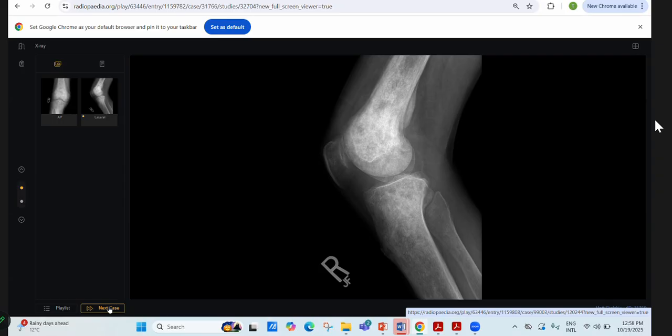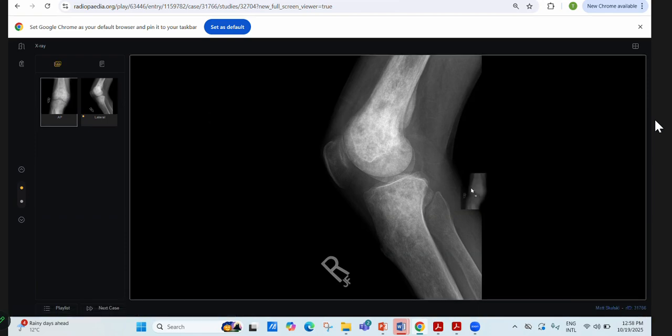Okay, I'm provided with frontal and lateral projections of a knee joint of an adult patient, in which I can see patchy areas of lucency and sclerosis diffusely involving the distal end of the visualized femur, and there is a subtle periosteal reaction along the anterior aspect of the femur as well. Similar findings are seen in the proximal tibia, and there is reduced bone density on the patella and visualized fibula. I would like to see other orthogonal views, and if this patient has a history of fever and chronic sinus discharge, this could be a case of chronic osteomyelitis.